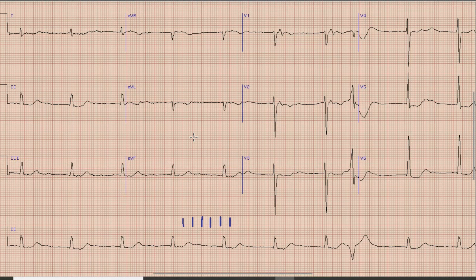After the heart rate, the next step in ECG interpretation is detection of axis. As you know, for axis we look at lead 1 and lead AVF. The QRS complex in lead 1 is isoelectric, which means that the R wave in lead 1 is almost equal to the S wave. While in lead AVF, the direction of the QRS complex is upwards. So as a whole, the axis is directed mainly towards lead AVF. So the axis in this case is vertical.